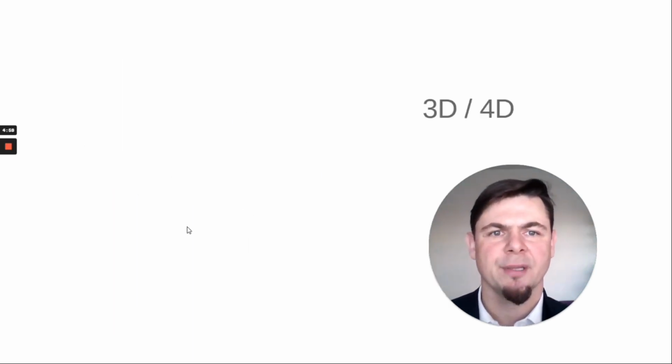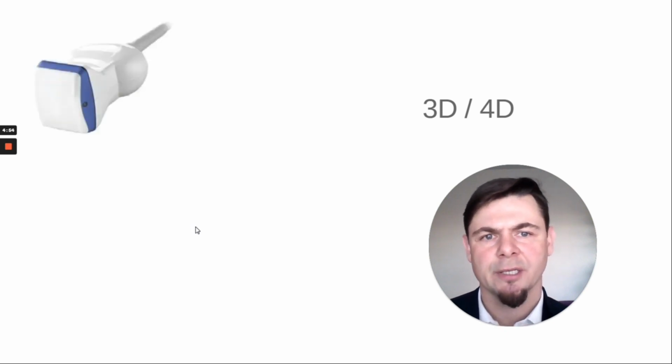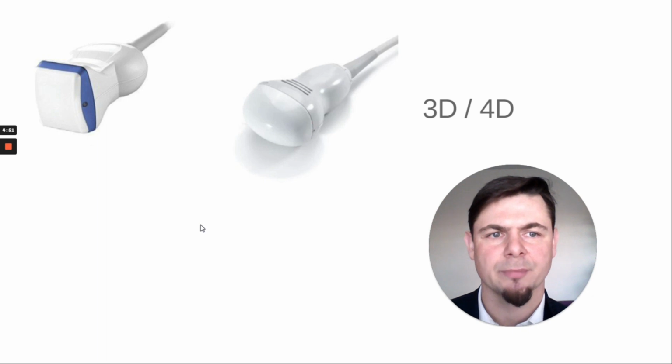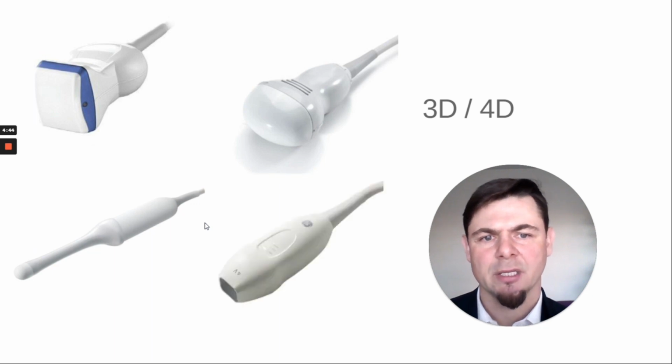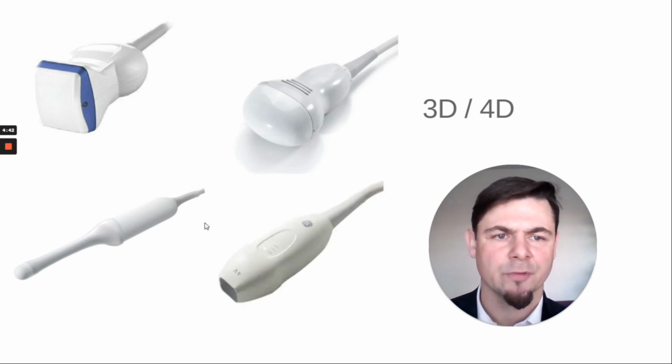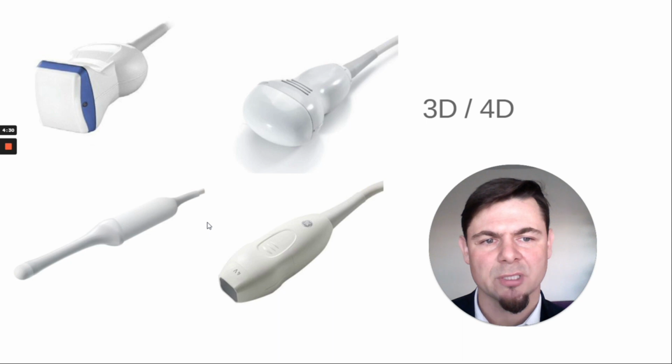Volumetric probes. Depending on the exam, you can find different types of 3D, 4D probes. Linear and convex are the most common probes for fetal examination. Endo probes are also often seen for fetal examination, and the fourth type is the volume sector probe for heart application. The crystal does an automatic electronic movement and gets the 3D, 4D projection on the screen. In addition, modern ultrasound systems have a lot of post-processing options to show the fetus better.